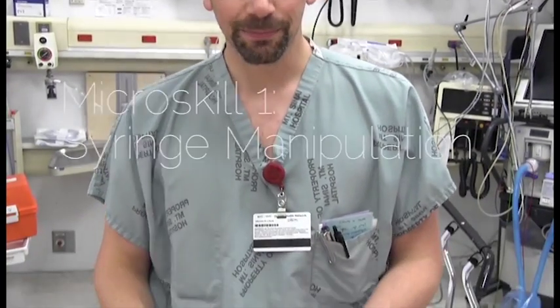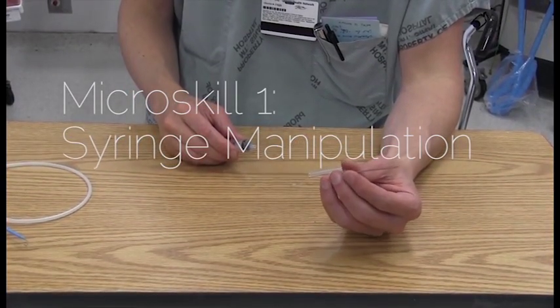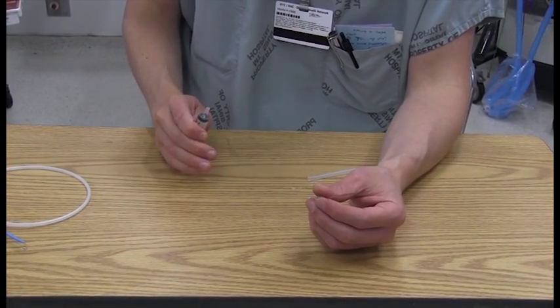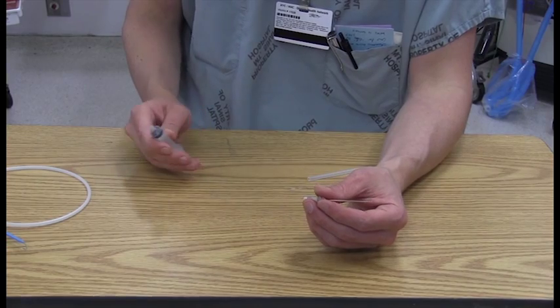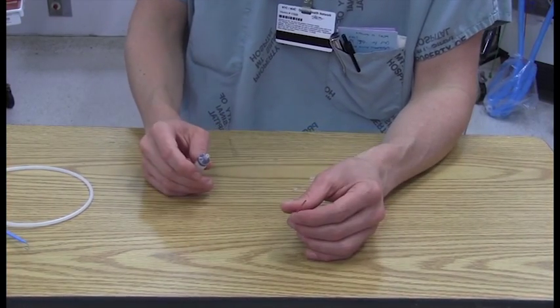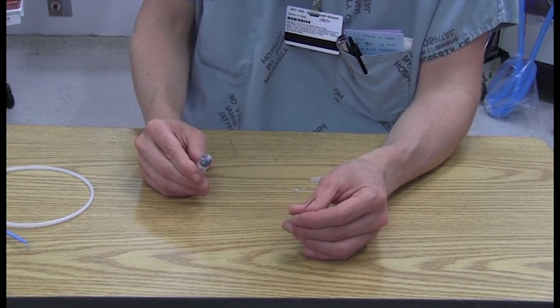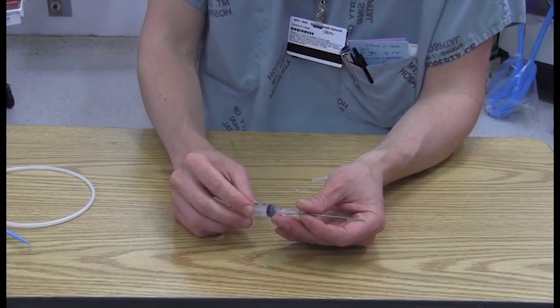All right, so let's show them what we got here. This is just a needle from a central line kit, and you don't want to use a dirty one, obviously. And my belief is that pretty much every resident should have one of these somewhere so that they could practice. Now, how they're going to get that, I will leave to you, because I don't want to be responsible for causing a lot of problems in the operations of your ED. But I think every resident should have these to play with.